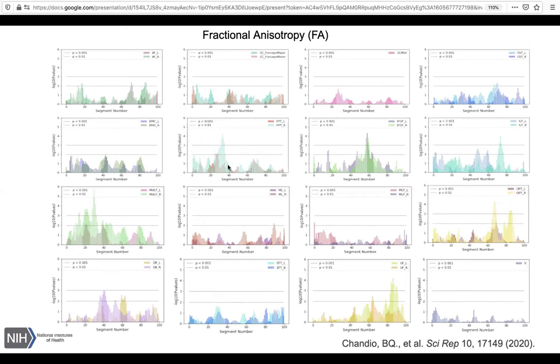In linear mixed models, the assumption is that there are no group differences. The mean between two populations is the same, but we reject that assumption when we have a higher significance, in this case p-value less than 0.001. So in FPT right, we see a group difference between segments 20 to 40. And in FOF, both left and right, we see it around 60.